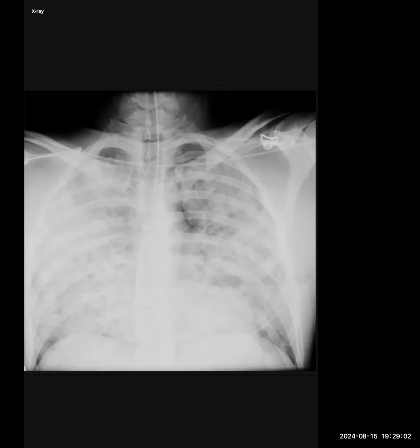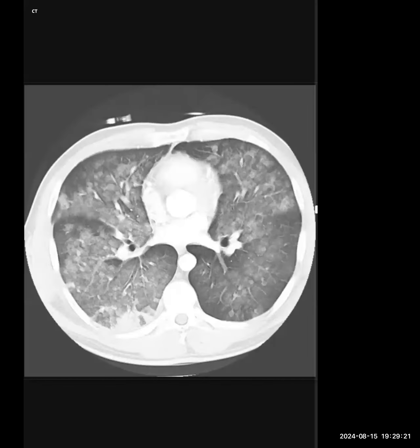Do you usually expect Pneumocystis jirovecii to be this florid? No, sir. It could be a pulmonary hemorrhage also. I would like to do a CT scan for this patient to further characterize this.